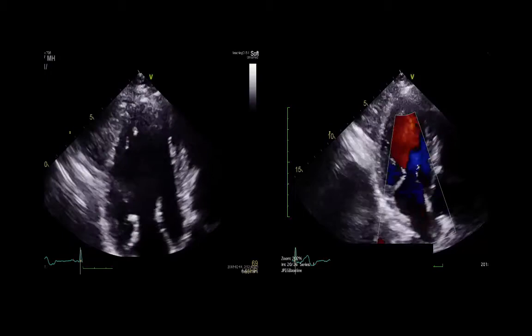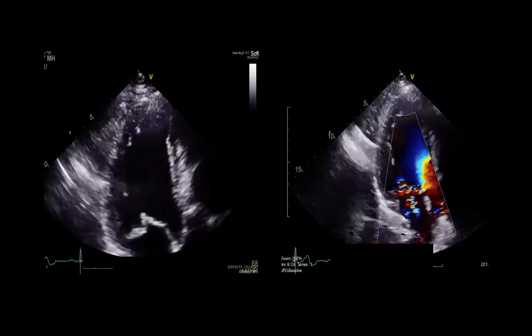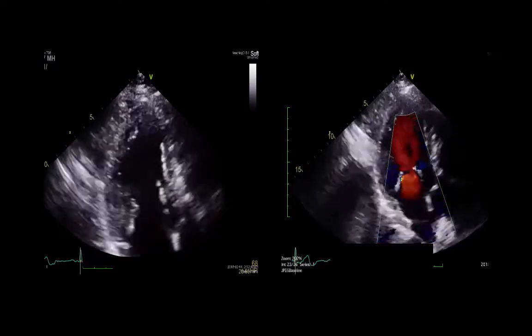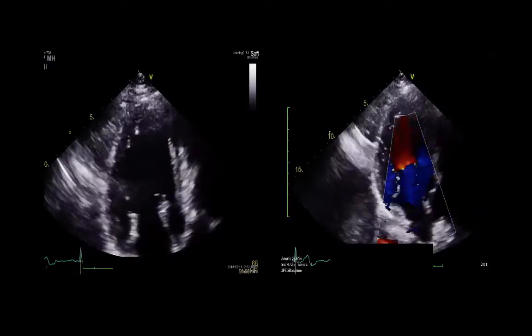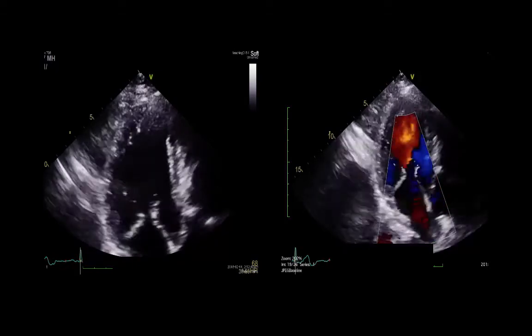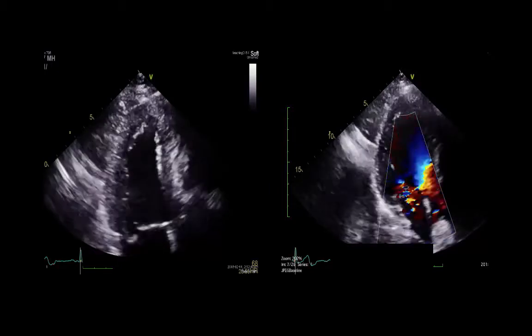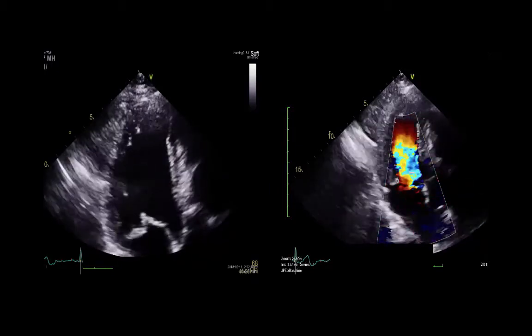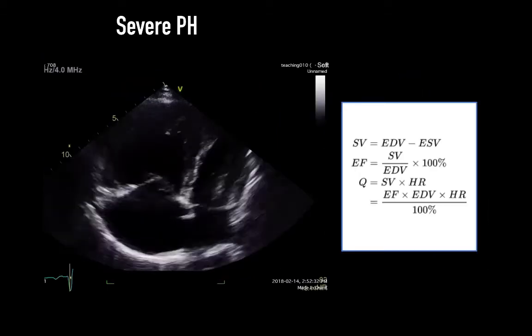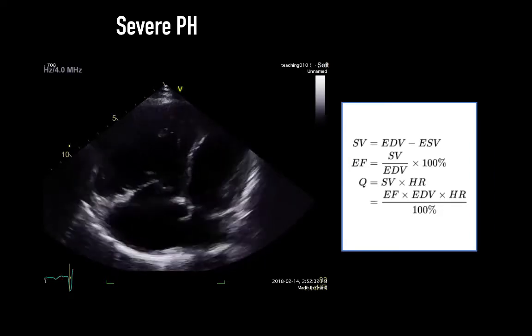Another example is a case of a patient with posterior mitral valve prolapse or a flail posterior mitral leaflet with severe mitral regurgitation. In this situation, instead of having to eject against the higher pressure of the aorta, the LV is offloaded by an ejection against the lower atrial pressure. This leads to an easier LV contraction and thus a higher LVEF than should be present based on cardiac strength. In these clips, the EF looks normal, which is not the normal response and denotes either chronicity of the MR or hidden cardiac dysfunction.